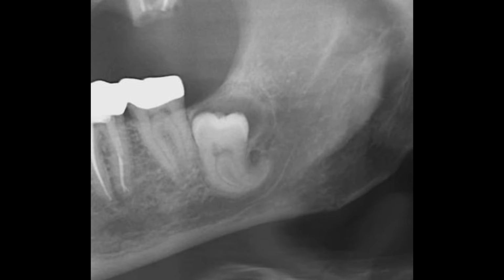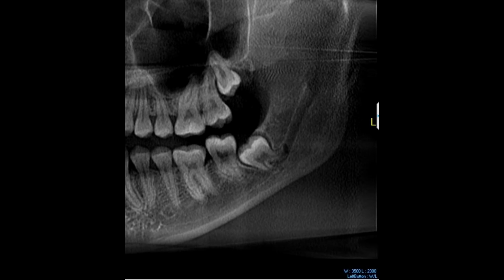This one that I'm going to pop up here is a little different, and this one's a little harder for me at times to see. That's when you get darkening of the apical portions of the roots. You can see on the distal root of this number 17 a fair bit of darkening, a little deflection, canals diverted, but the darkening is what I wanted to point out here.